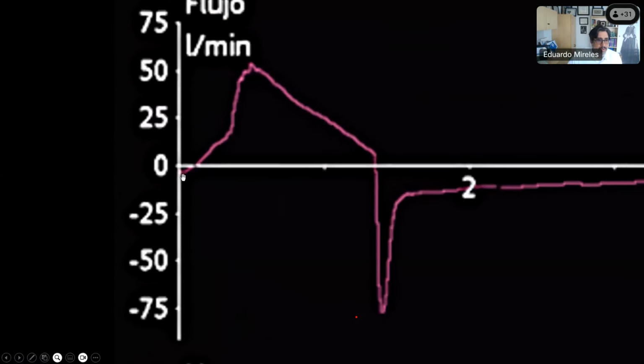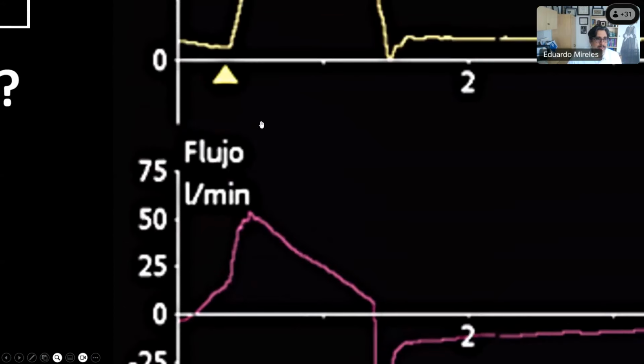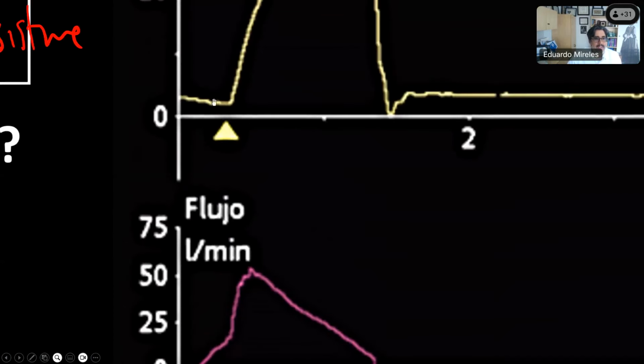You can see how the flow has crossed the baseline really close, around one hand, 10 fingers, 10 little electronic fingers away, okay? And if I go up here, you can see that the ventilator triggers 1, 2, 3, 4, 5, 6, 7.5 little hands away.